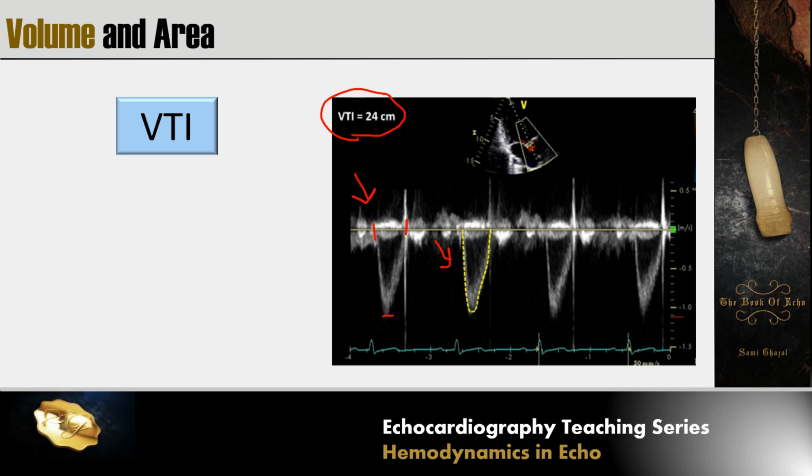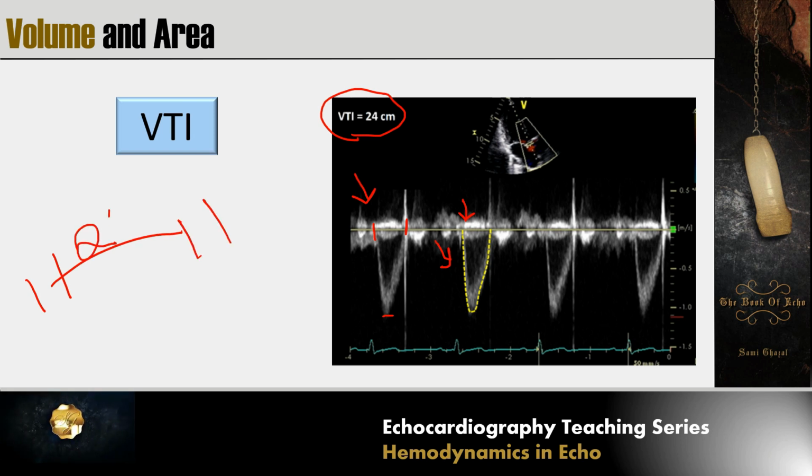It represents the distance that this flow traveled. So this flow has traveled from here to here, and the distance is 24 centimeter.